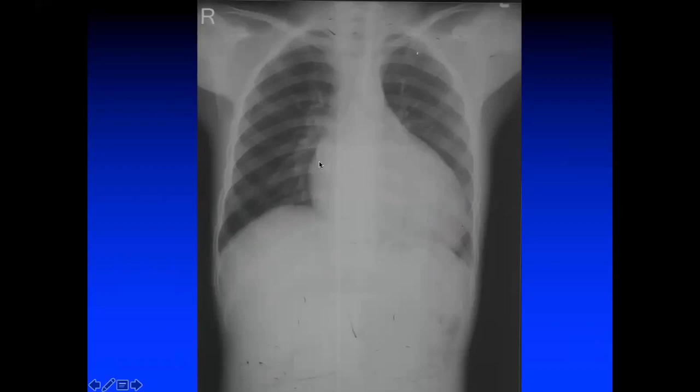You can also note a double atrial shadow, and this is grade 2, it just touches the right atrium. So grade 2 left atrium, then the straightening of the left heart border, and other findings. So this is a case of mitral stenosis with MR. Generally you can sometimes get a combined lesion. So if you have MS with MR, one of the classical X-rays will be this.